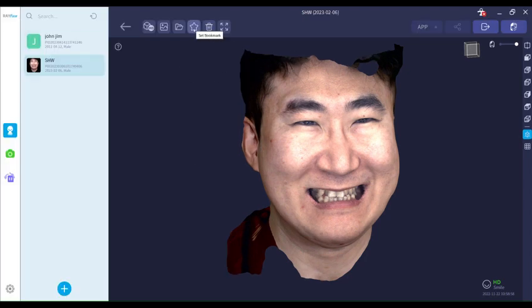You can make it your bookmark, one of your favorites, or you can also go into the open captured data folder where when you click on that, it shows you the raw data from the facial scan which was completed by the 6 different cameras which are located on your facial scanner. You also have the options to see portraits, so you do not need to take additional photographs.